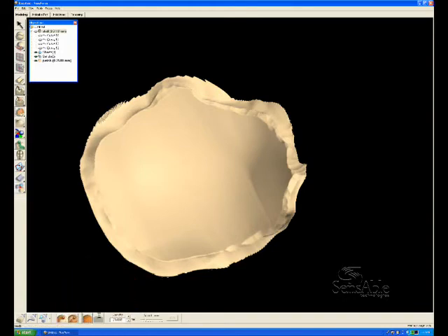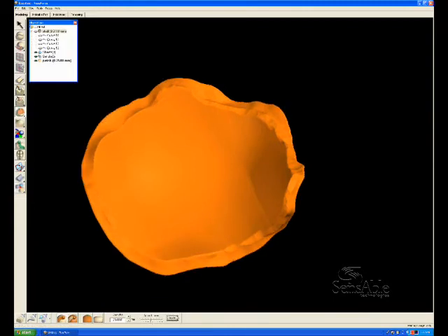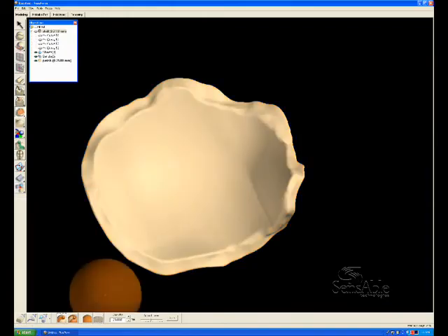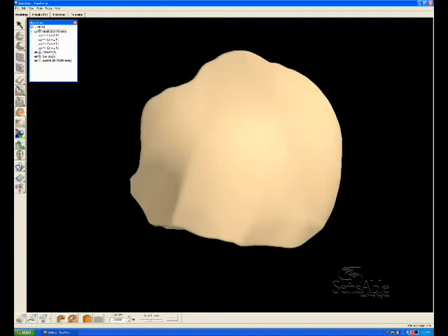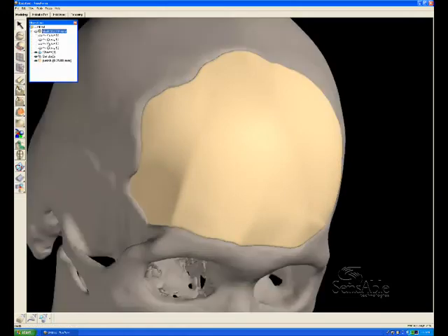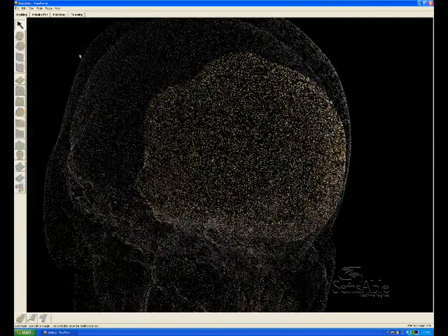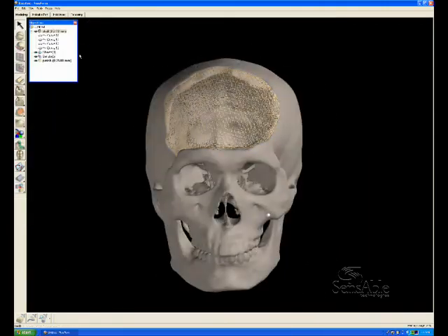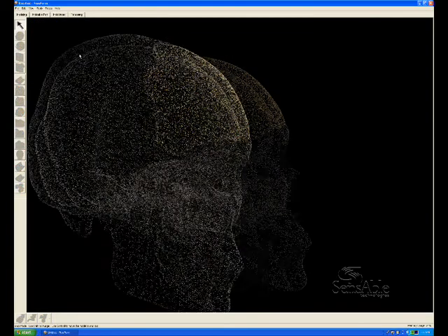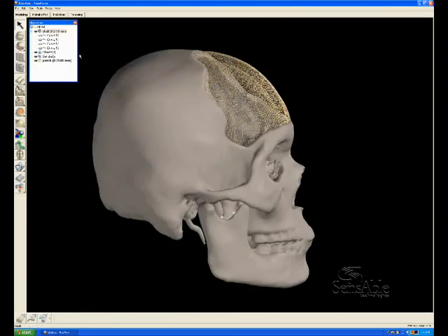And then we go through a smoothing operation in order to clean up the noise right along the edge there that resulted from the Boolean operation. At this point, we're pretty much finished. A chamfer edge could be added to the backside, or it could be left simply as is, because at this point we have a perfect fit with the scan data from the patient. And that concludes the skull patch implant demo using FreeForm Modeling Plus version 8.2.